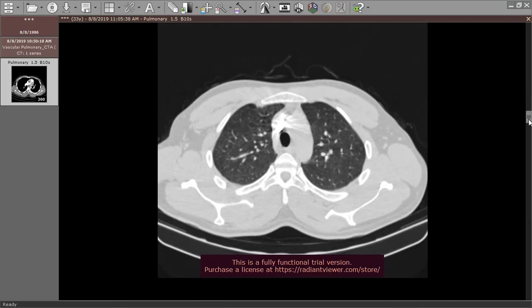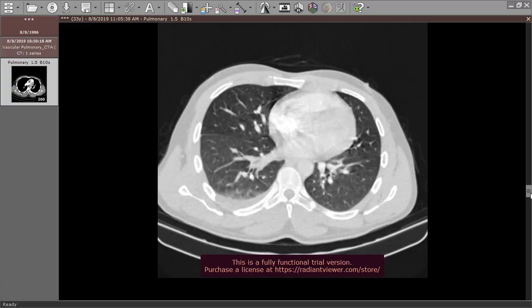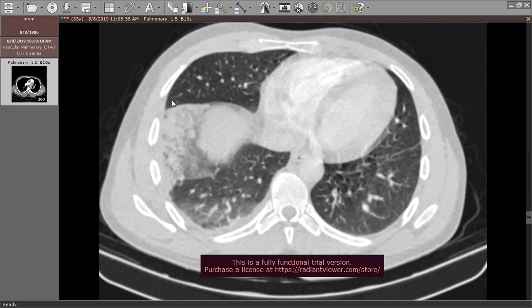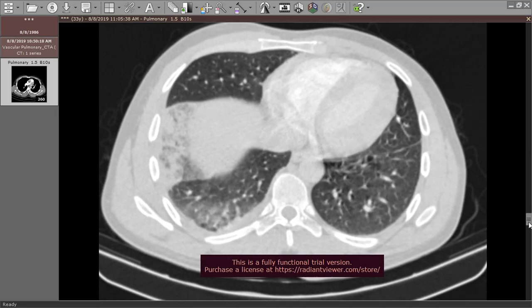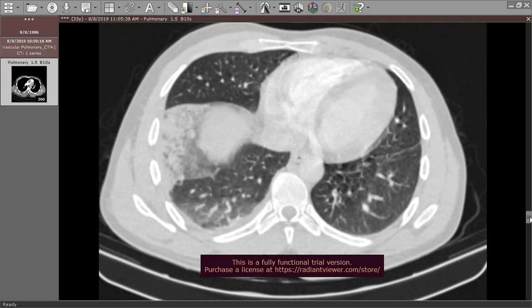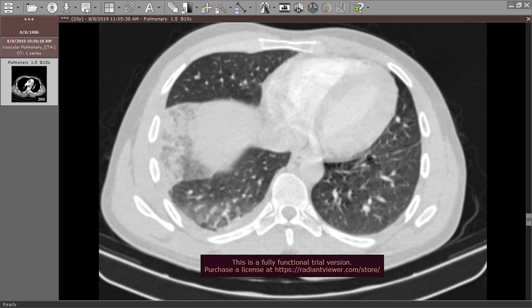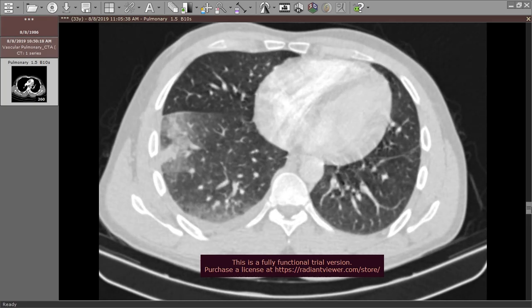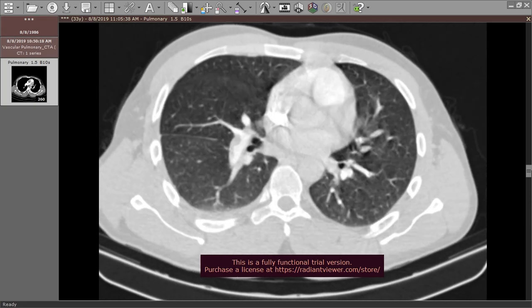We can refer to the lung window as well to see the appearance of this pulmonary infarction. It looks bubbly here, a bubbly appearance with mixed consolidation and ground glass material. Sometimes it appears like this, sometimes like a consolidation, sometimes like a consolidation with internal ground glass, what's called the Atoll sign.